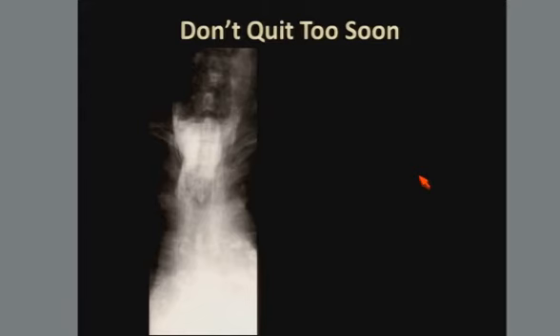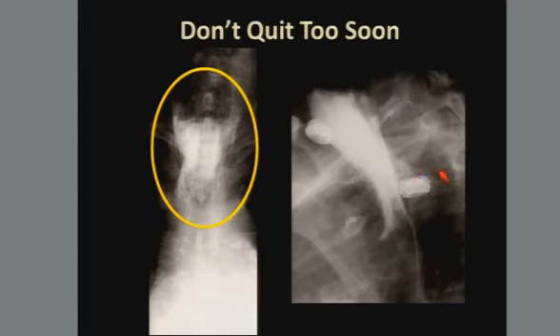Here's an example of you need to really focus on the history. This was actually a recent case of ours, not a postoperative, but a post-endoscopic. Was having dilatation of a distal esophageal stricture, post-procedure chest pain. Chest CT revealed pneumomediastinum. So this swallow was performed, and you can see contrast here that was thought to be pooling in the pharynx. And on the oblique view, and notice the oblique view where it's centered really on the upper thoracic and cervical esophagus.